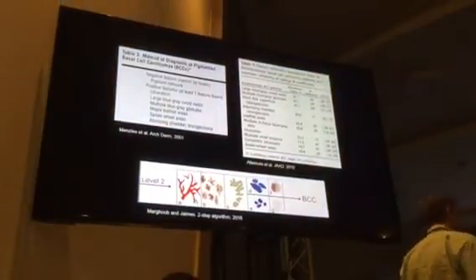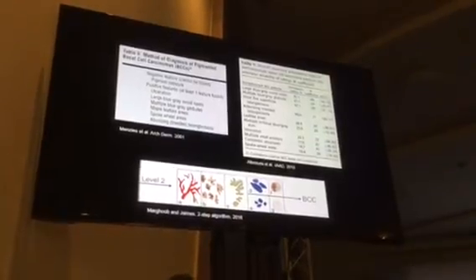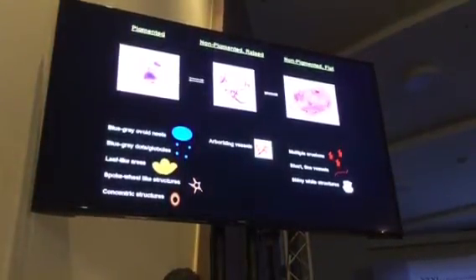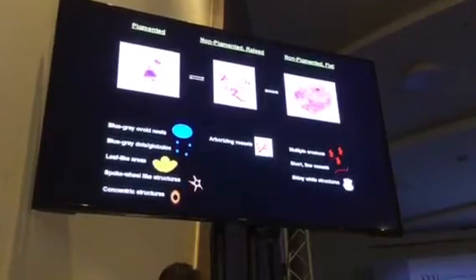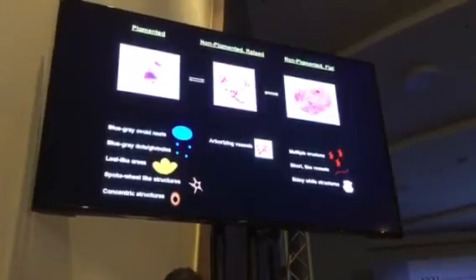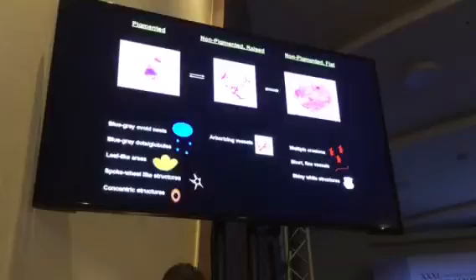Studies that have looked at dermoscopy and basal cell carcinoma have identified many different dermoscopic features. What I find to be somewhat helpful, especially for people who are beginning to use dermoscopy, is to simplify the approach based on the clinical appearance of the basal cell carcinoma. This helps you identify, for this particular lesion, what are the dermoscopic features that are most important in arriving at the correct diagnosis. So for me, I break them up into pigmented basal cell carcinomas.